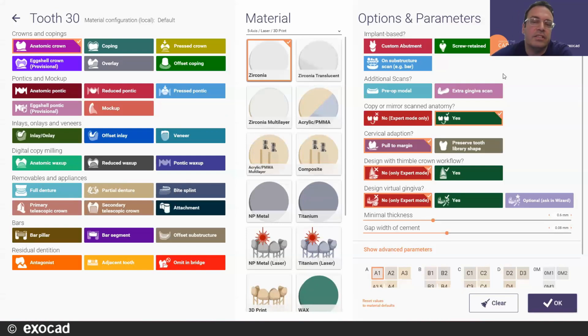On the right side, there's a button for stock abutments and the implant-based options. That allows manufacturers to create abutment libraries for stock abutments. It just gives you a more accurate design. So instead of scanning the titanium part, you can actually do the scan body workflow for those. And the software will filter and show you only stock abutment libraries when you choose that button.